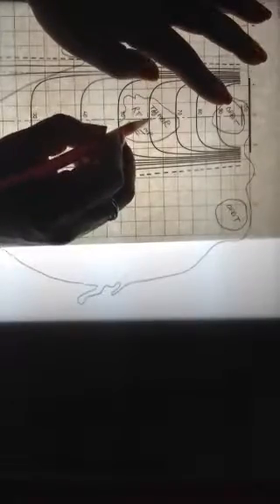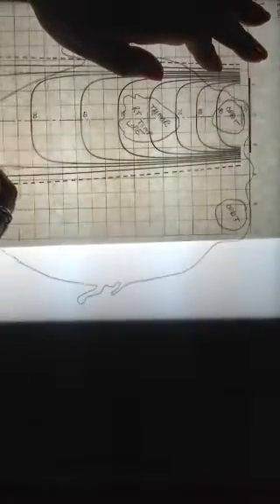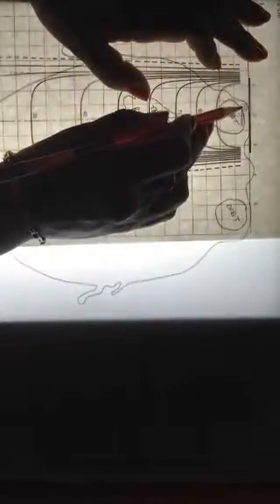Again, I'm going to put the T at the beginning of tissue. I want to make sure the central axis on the isodose chart goes right through the central axis that I've designated through my tumor. Where I put that dot, I made that X, I have to make sure this goes right through that. Then I'm going to begin to trace the isodose lines. First, I'm going to trace the T-bar, then I'm going to trace the central axis, and then I'm going to trace each of the dose lines.